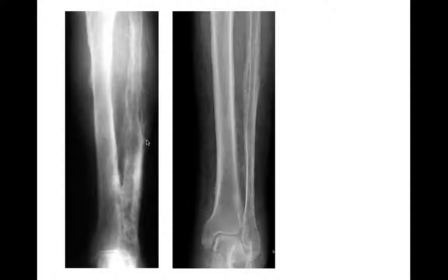This one looks a little more bizarre. This one is more typical of benign or solid appearing periosteal reaction in venous stasis. Can I tell you for sure that this is venous stasis? No, there is a differential for this, but this is one of the more common ones that causes this. So this is venous stasis.